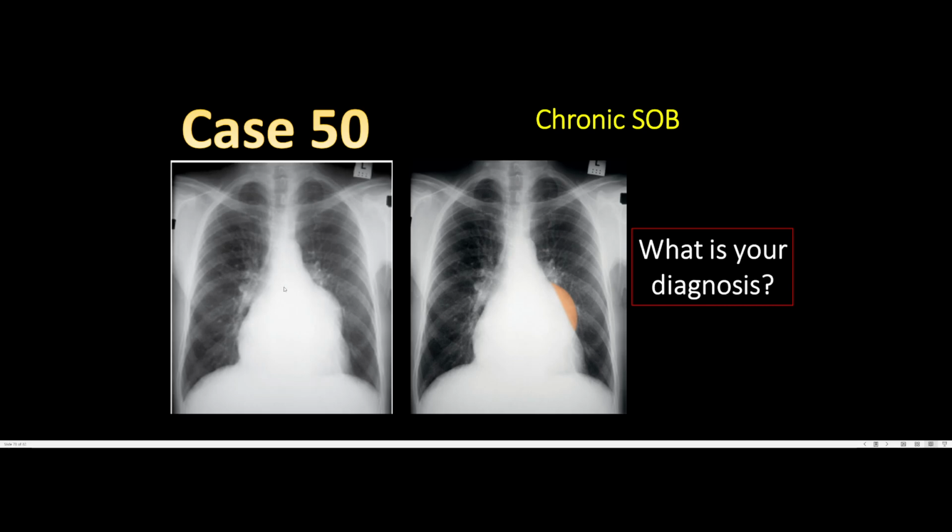So this person has a left atrial enlargement specifically, and left atrial enlargement could be due to mitral stenosis. That's the most common cause. So you'll often order an echocardiogram to know if this patient has a valvular heart disease, for example. Also, the patient may have an ASD. Patients with atrial septal defect might have a left atrial enlargement. You can also keep this as a differential diagnosis.